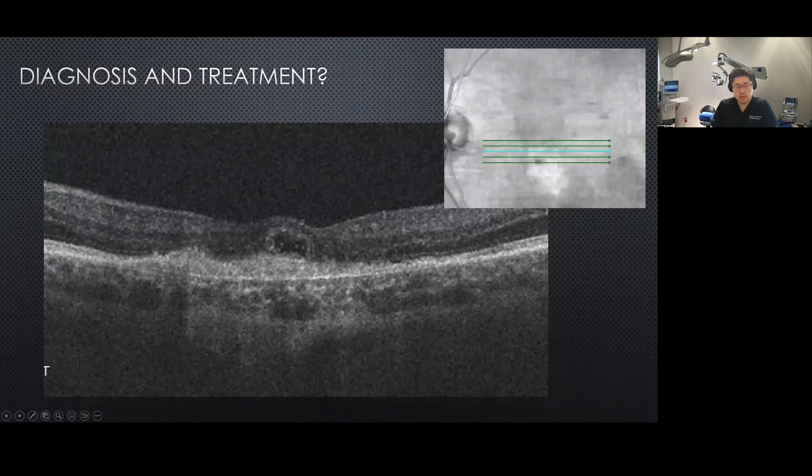So this is a patient that was sent for repeat treatment of macular degeneration, which she had stopped many years ago. She had a history of macular degeneration, received treatment, and anti-VEGF treatment was stopped 3 years ago. So she was referred for intraretinal fluid and possible repeat treatment. You can see that the vitreous cavity is clear. The epiretinal surface or vitreomacular interface is normal. Intraretinally, you see this cystic-appearing structure with hyper-reflective lining and hyporeflective lumen, overlying this area of atrophy or subretinal fibrosis.